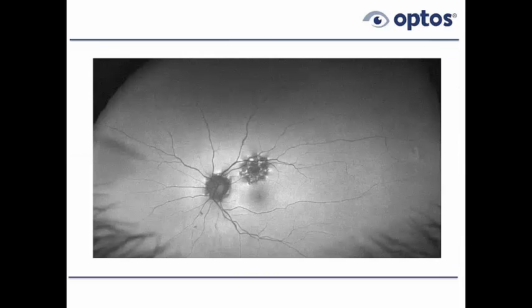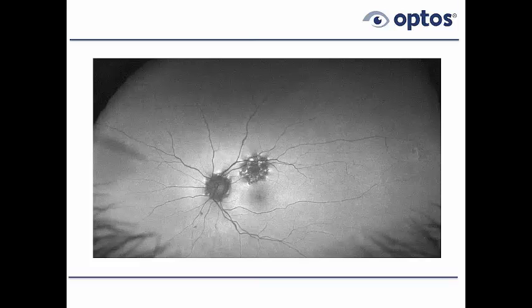Now, Azor, you might say, oh, I'll never see Azor. You might not, because early on it's invisible to ophthalmoscopy. Then it might be simple to see, but the autofluorescent images are very, very useful. Larry Anuzzi, who's a friend of mine, put together a paper, some of my cases, but cases from a few different facilities, and he actually looked at 300 Azor patients and reported, I guess within the last 12 months, on 300 Azor patients. So it's not that rare.